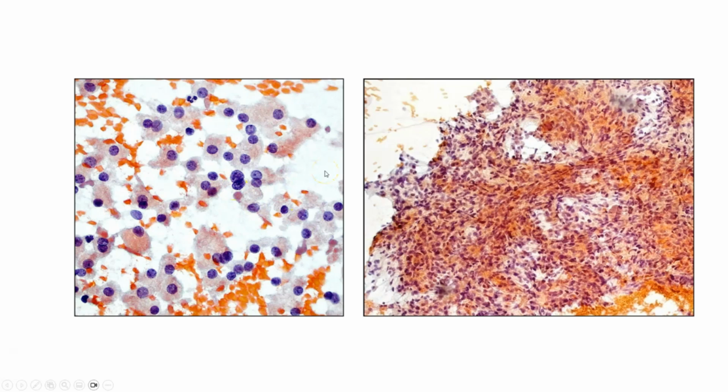And here are some of the features that are described in oncocytic neoplasms: the dispersion of the cells, binucleation, and tissue fragments with traversing blood vessels. These are not specific features for neoplasia, but they are corroborative.